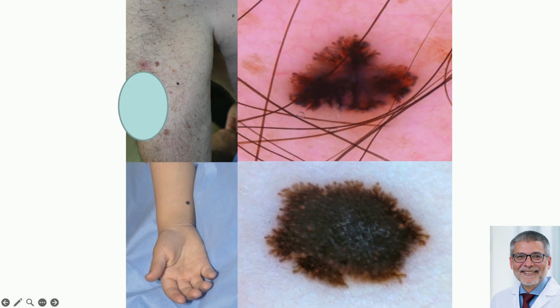And I just gave you two examples of a starburst pattern, but I can tell you that if you took the top one and put it on the individual at the bottom who is 5 years old, it's benign. It's a benign pattern. You don't get superficial spreading melanoma with a starburst pattern in kids. It just doesn't occur. And if I saw the bottom pattern in the individual on the top, it would still require a biopsy. But remember, 50% of the time it'll still be a Reed's nevus. It's not that it is a melanoma, but a 50% chance that it will be a melanoma. So age is the only discriminator for this pattern.